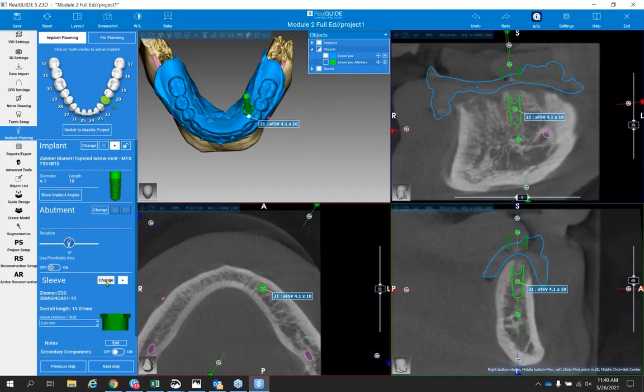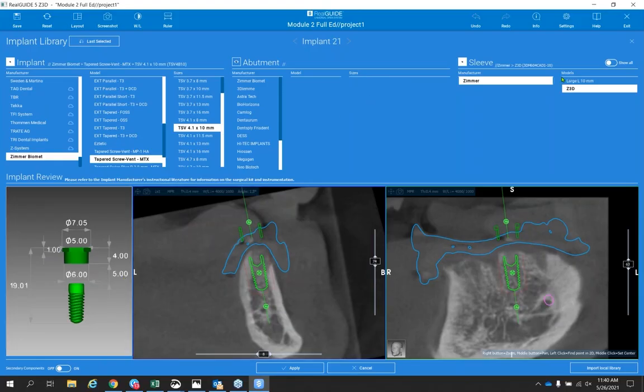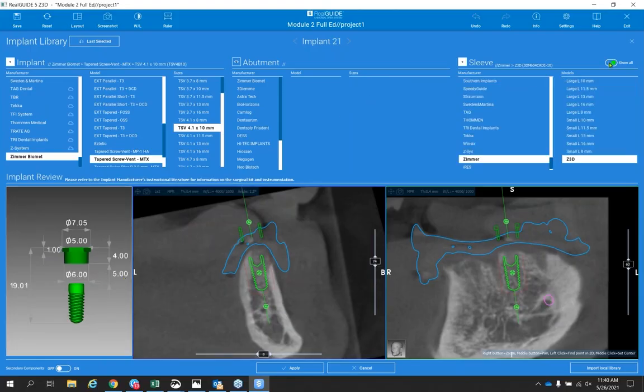In terms of the sleeve, I want to verify that my sleeve position is correct and that it's the right sleeve for this implant. So the software will bring in the manufacturer's recommended sleeve setting for you, right? And then we really don't want to mess with those and change those dimensions if we can help it. I just developed a habit of going in, verifying that I indeed have the right sleeve. So I will turn all the sleeves on that are in the software.